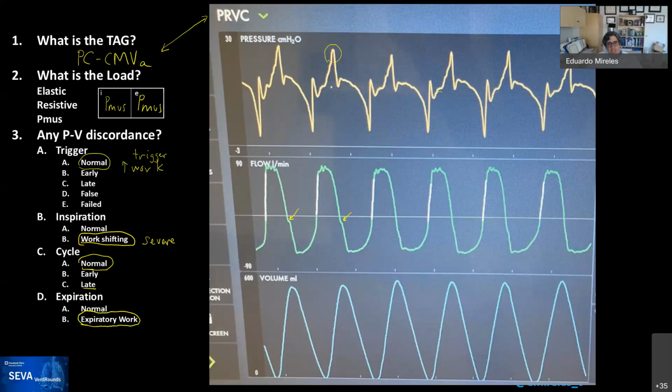If you remember the adaptation, what happens with adaptive is you set a target tidal volume, and the machine will adjust the inspiratory pressure up and down to achieve the tidal volume that you want. If the patient is doing effort and getting more than you set, let's say what you set was 400 cc tidal volume, so I'll put this line to denote those 400 mLs, the ventilator is going to drop the pressure as much as possible, which in this case is the baseline PEEP.